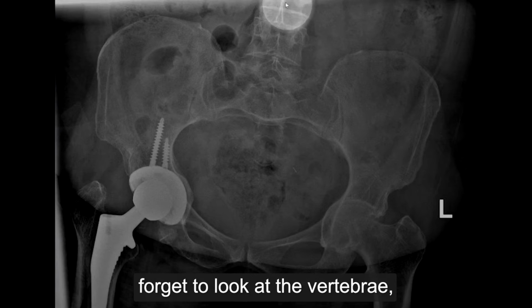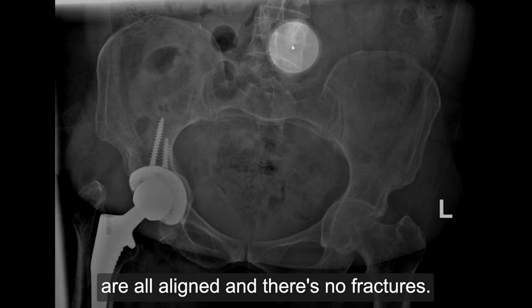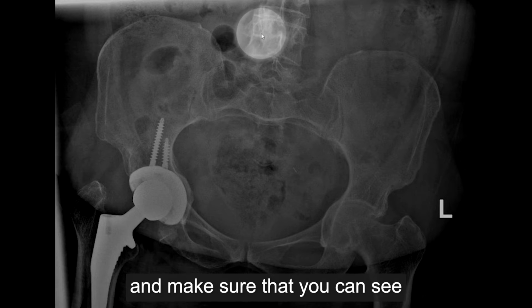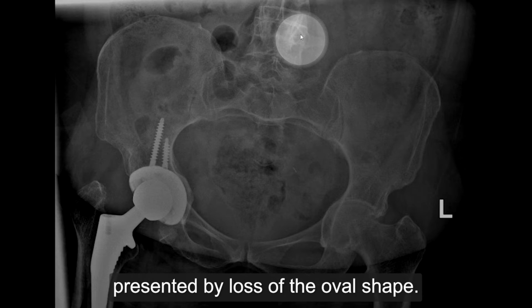And don't forget to look at the vertebrae because you could get a vertebral fracture. So you need to make sure that the spinous processes are all aligned and there are no fractures. And also look at the transverse processes, make sure there's no fracture. And make sure that you can see these oval shadows that represent the pedicles because you may get a pedicular fracture presented by loss of the oval shape.